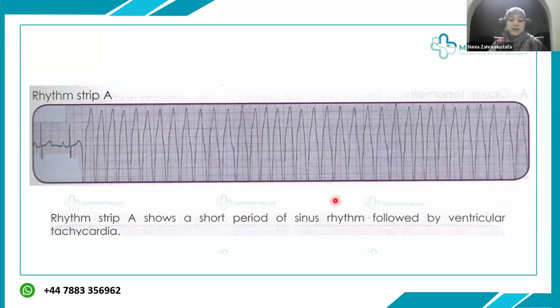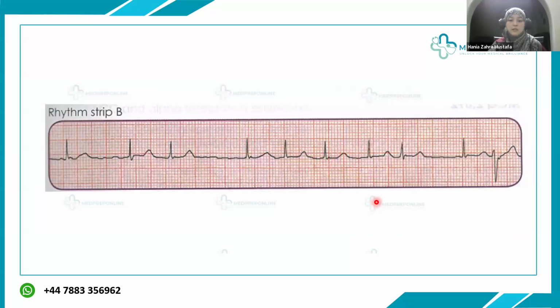Please get yourself familiarized with these rhythms, because they do ask questions about the management of ventricular tachycardia and VFib as well, when to give defibrillation and when to start CPR and everything. You need to familiarize yourself with the patterns. Can anyone tell me what this ECG is telling us?